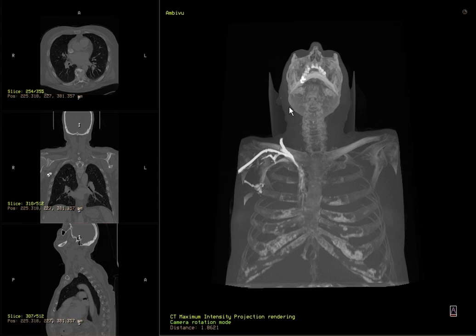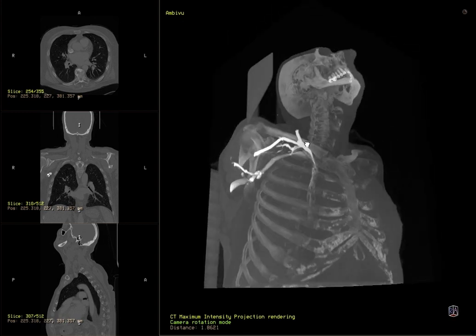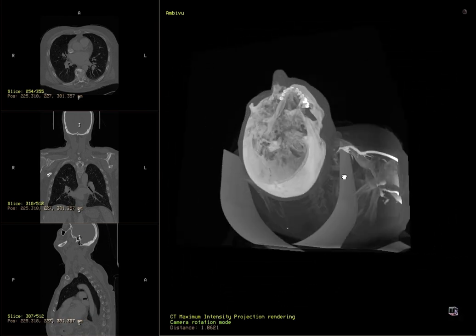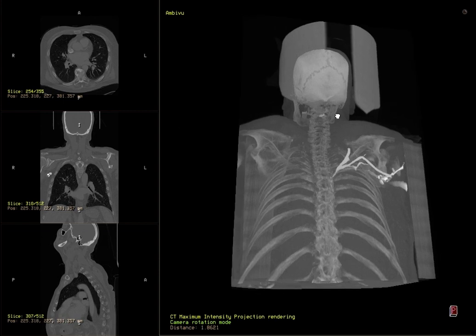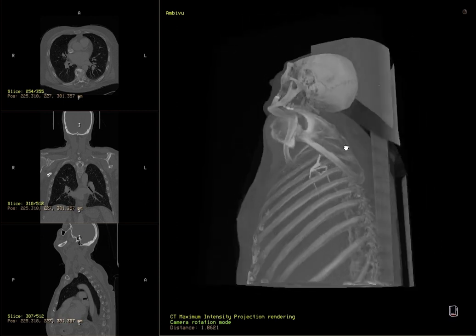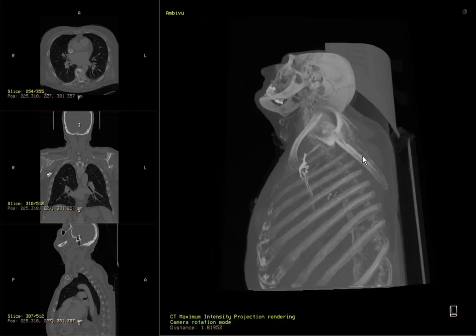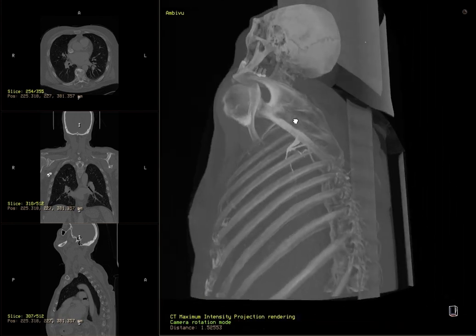Volume rendering can work with volumetric data from any modality: CT, MRI or PET. For this presentation I'm going to load some CT data. This is the main view. Mouse dragging rotates the camera around the object. It is fairly easy to navigate and find the best view, regardless of whether the volume was scanned axially or not.